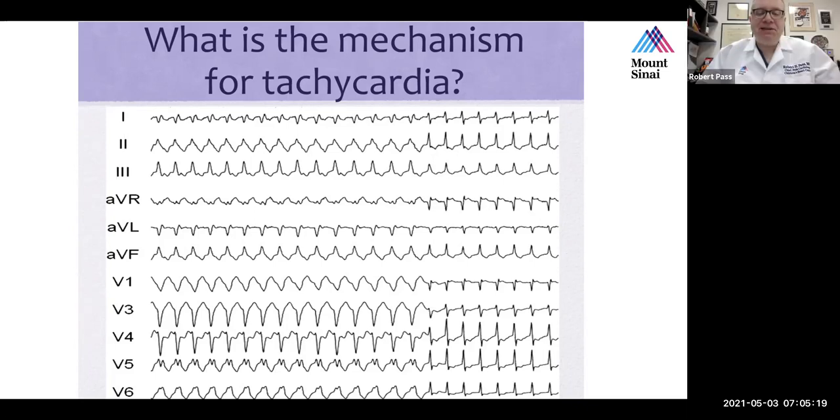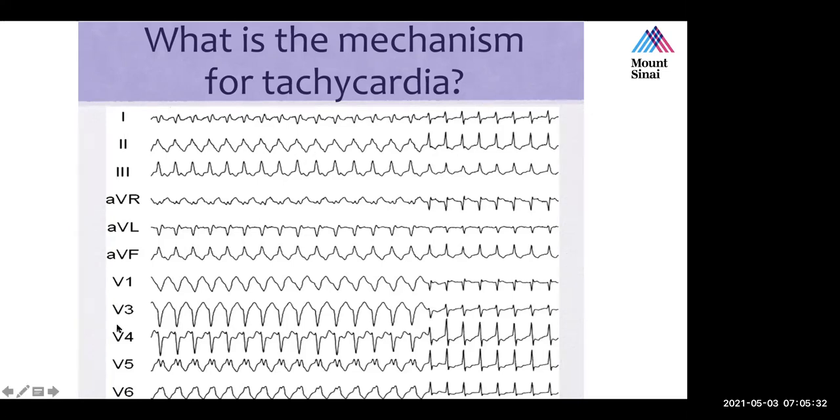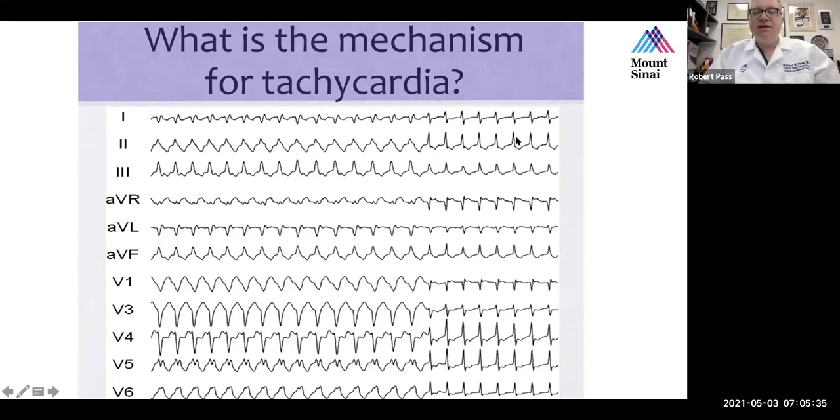No, when you got it right up to the end, so I'll give you full credit for that. But no, when it's the ipsilateral side. So ipsilateral. So you're right. It's a wide QRS that becomes narrow. Now it's possible that these are two different arrhythmias, but it's much more likely that this arrhythmia is the same, right? Why would two rhythms or two QRSs that are fast be almost exactly the same rate? It would be kind of bad luck to go from VT to SVT, right?